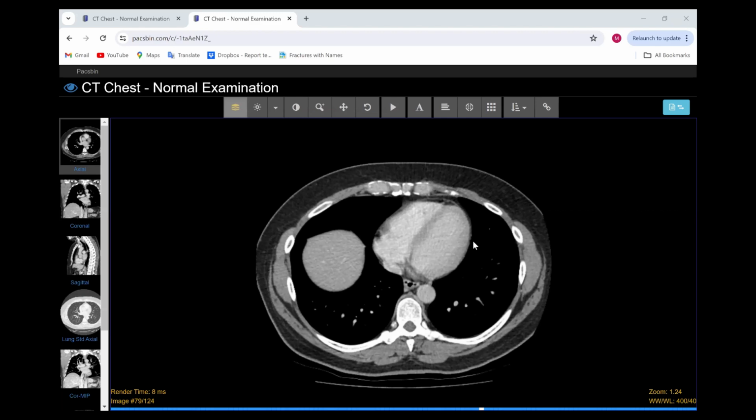Yes. Not involved in the common cases, ground glass. But we have some cases that contain ground glass. Ground glass could be anything. It depends on the clinical history of the patient.